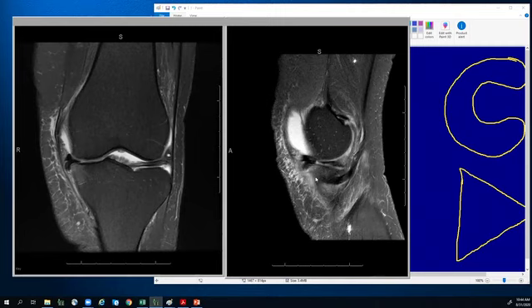All right, great. So hopefully this makes some semblance of sense. The complex tears are more difficult to understand than the basic tear patterns. I wanted to show just a few more case examples, which I feel would be helpful.